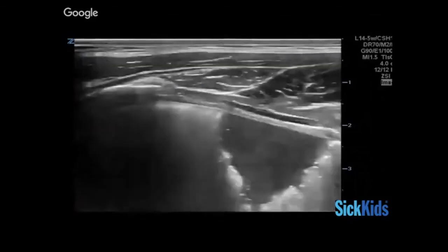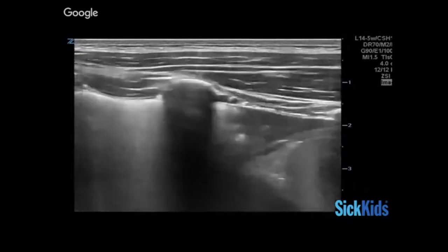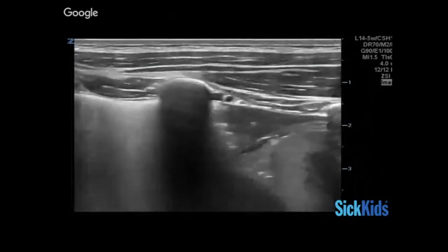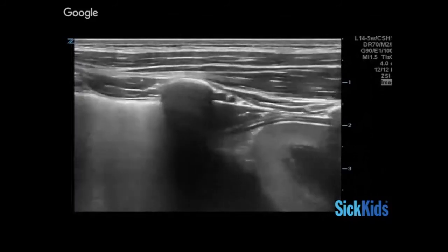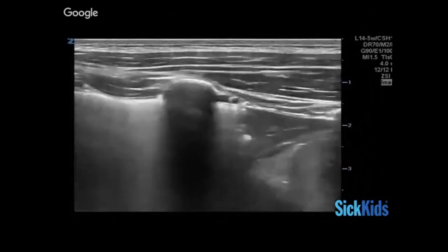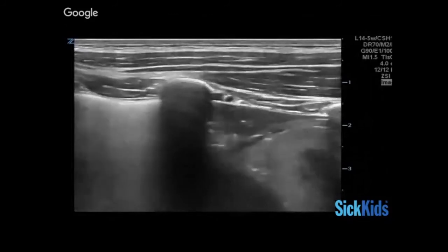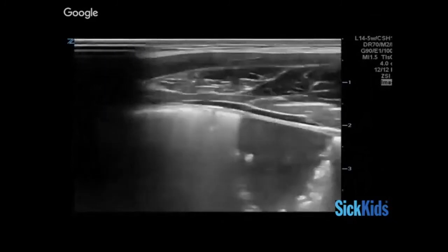So here the diaphragm is well visualized, just distal to the lesion on the right of the screen there, where you see that dome-shaped structure, commonly seen with 3 layers. So 2 outer echogenic layers of pleura on one side and peritoneum lining on the other, and an inner echogenic layer of connective tissue that's surrounded by hypoechoic muscle stripes. So when you see a lesion, it's important to trace it to the top to make sure that you're seeing true pleural lining rather than something that may be below the diaphragm, in which case you would see this dome-shaped structure with 3 layers, sometimes 2 layers.